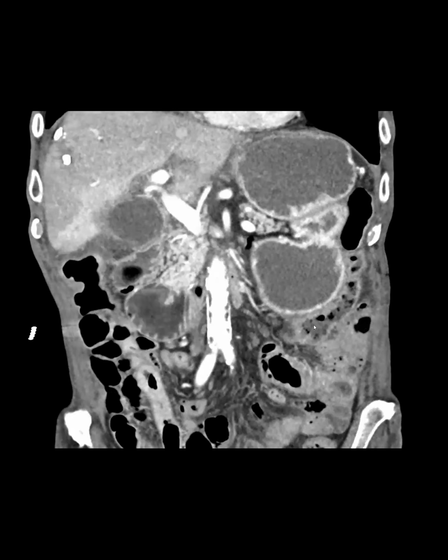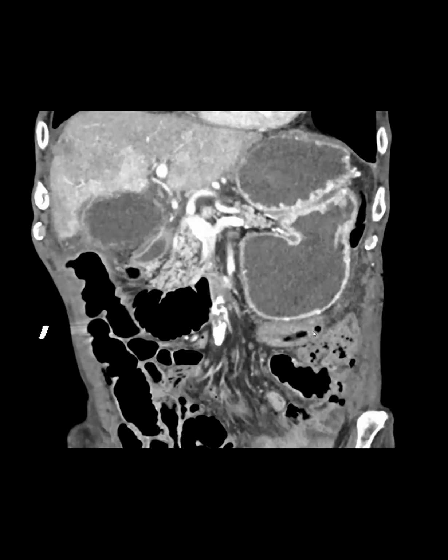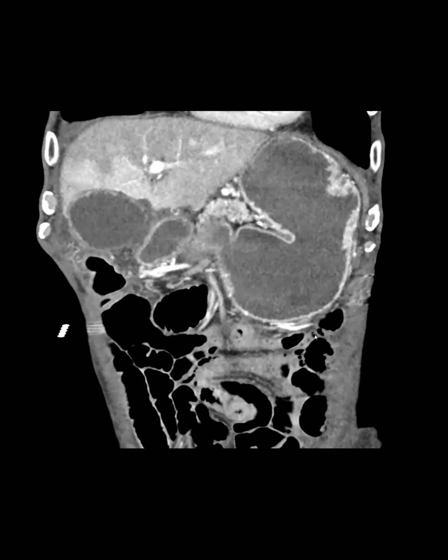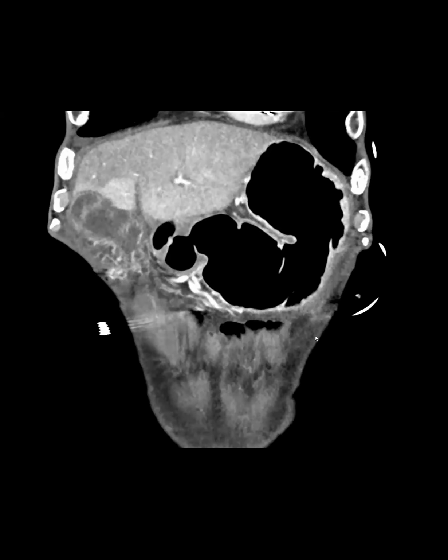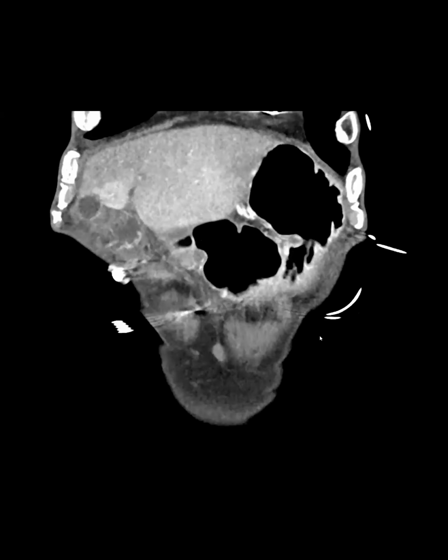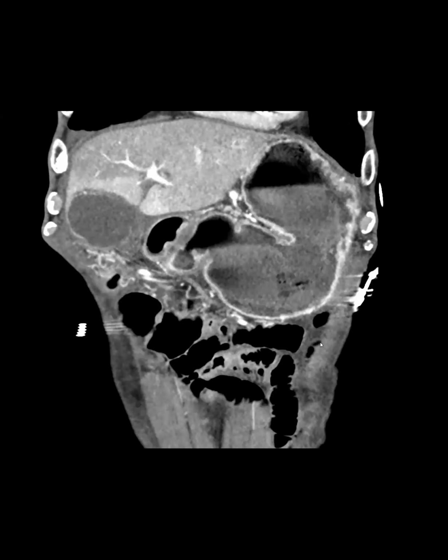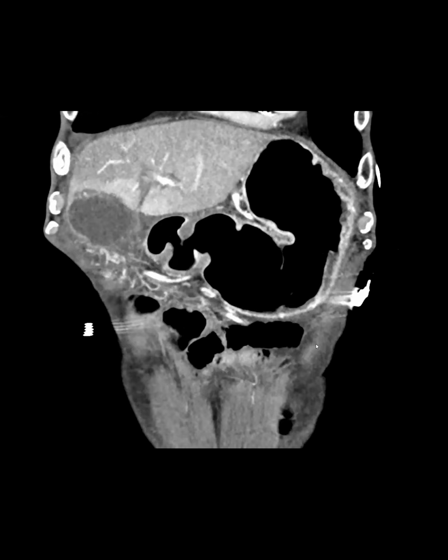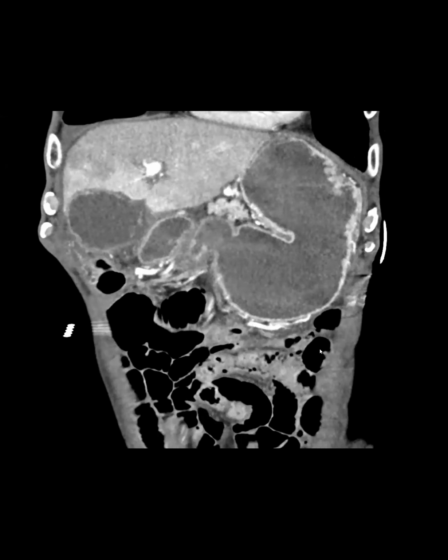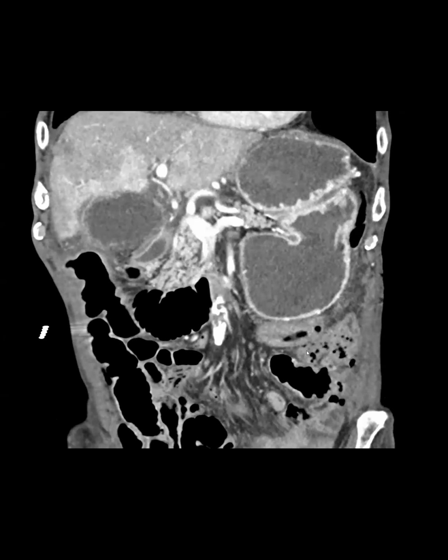Yeah, sure. So we have a coronal CT with contrast here that's in the arterial phase, and we see that the gallbladder is distended. The wall is enhancing, but it's kind of irregular. There's nodularity to it. And at the inferior portion of the gallbladder near the fundus, you can see portions of the wall that appear to slough off, or like the adherence isn't there anymore, or like discontinuity within the wall. So all things considered, this is suspicious for a necrotizing gallbladder.